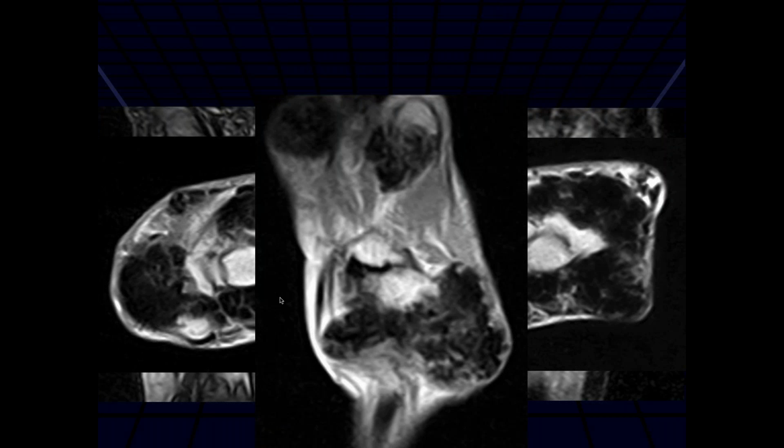I mean, the other thing is some form of systemic disease. We talked about amyloid earlier. Amyloid could be low signal on both. Of course, I think that this is systemic. That's scleroderma. So this is scleroderma. So there are a number of pathologic entities that involve the soft tissues that can involve the whole body. In this particular case, we just saw one dermatomyositis before. This is scleroderma in this particular case.